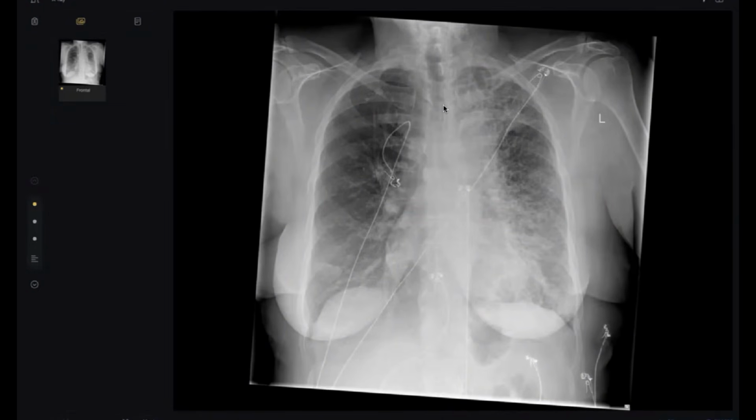This is the X-ray chest, frontal projection. There is reticular shadowing seen in the lungs bilaterally, more pronounced on the left side. The heart border appears shaggy on the left side. There is loss of lung volume also seen on the left side. There is no evidence of any pneumothorax. The bones appear grossly normal. So these findings may represent interstitial lung disease, but usually this lung disease occurs bilaterally.